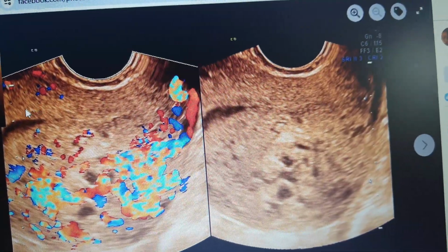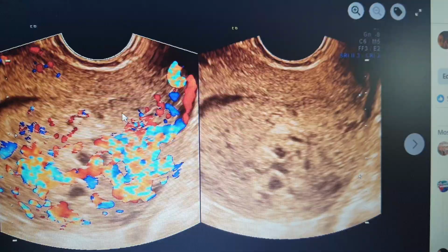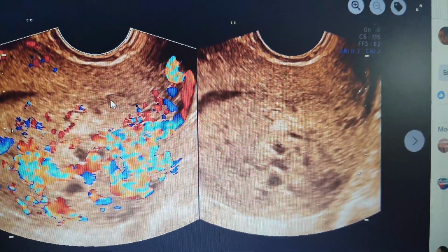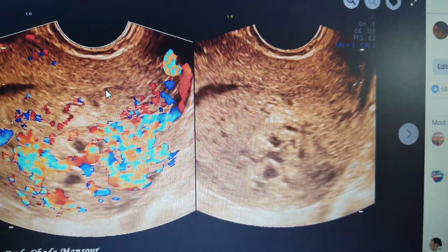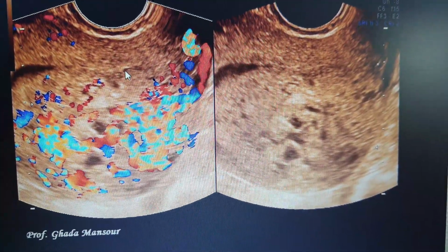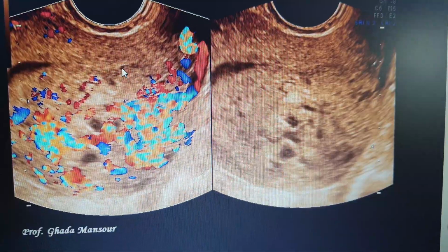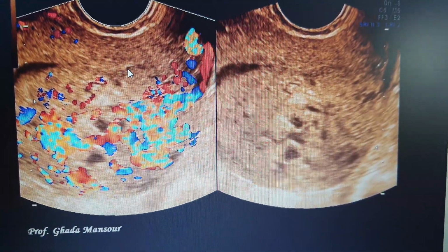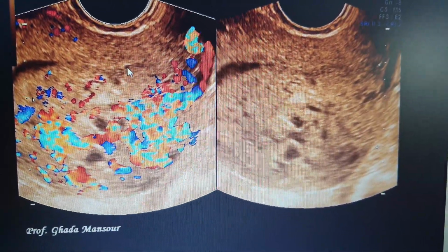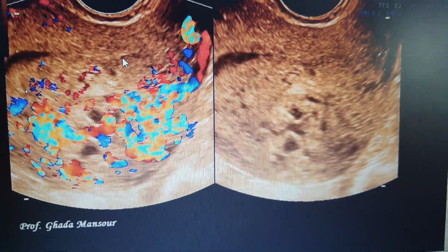So it's very important to imagine where is the line of the endometrium or the endometrial cavity, and this is very important. And if you know that this case was a case of molar pregnancy, and that picture is post evacuation, after evacuation of this molar pregnancy, and unfortunately there was a misdiagnosis or misinterpretation of the picture by someone who mentioned that there is still contents.